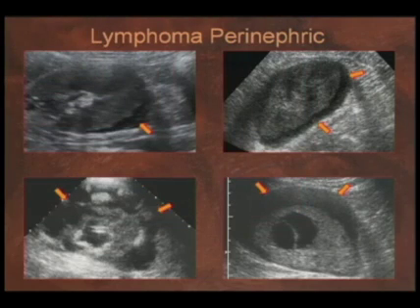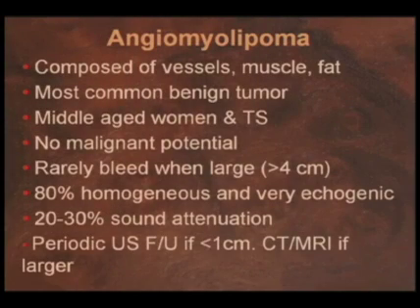And these are 4 different examples of perinephric infiltration of lymphoma that look very similar to perinephric fluid collections. So just keep that in mind when you're faced with that appearance.